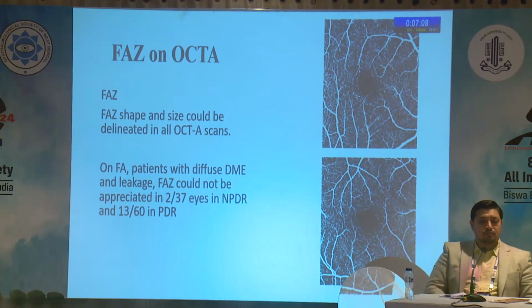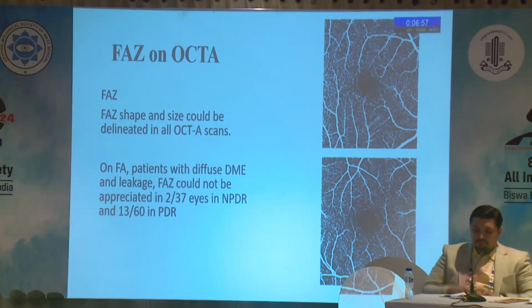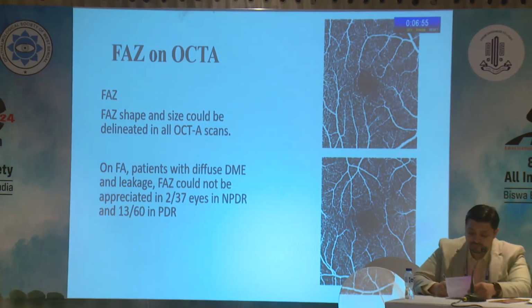So initially people studied both superficial as well as deep, but just to tell you in a nutshell, in today's scenario, if you have to assess FAZ, you assess FAZ on the deeper vascular plexus and not the superficial vascular plexus.